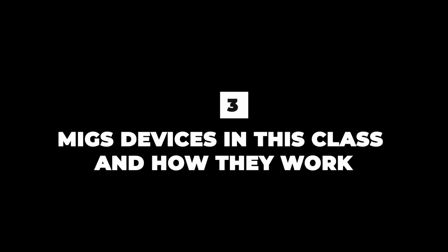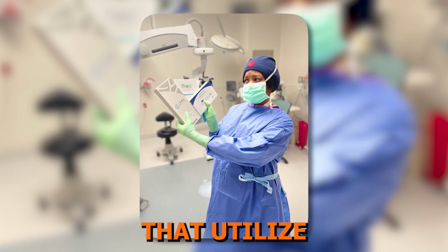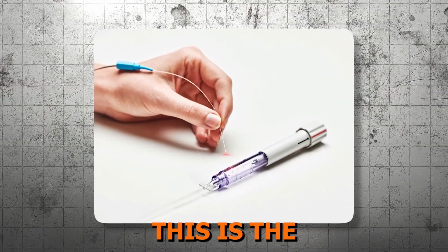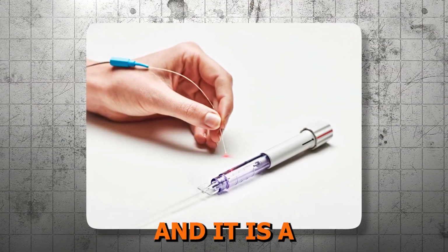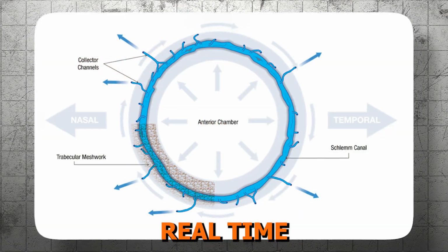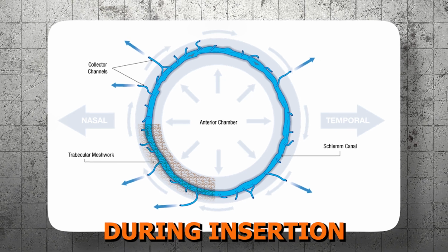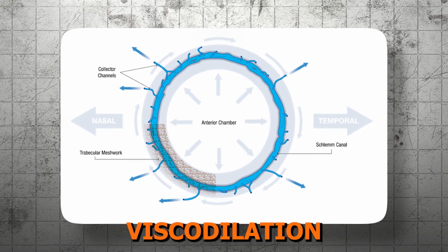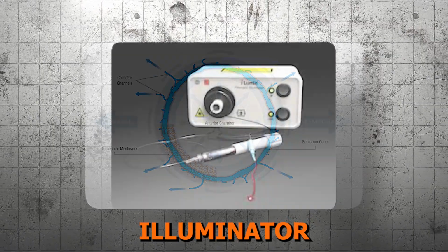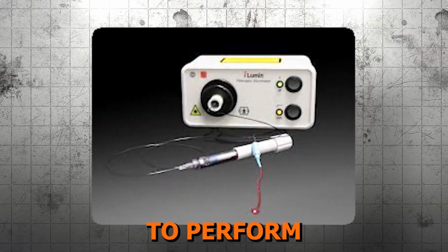Lesson 3. MIGS devices in this class and how they work. Now let's go over the devices that utilize canaloplasty. First up, we have the iTrack microcatheter. This is the first generation of the iTrack, and it is a flexible catheter with an illuminated fiber optic tip that allows real-time visualization during insertion and provides circumferential viscodilation of Schlemm's canal up to 360 degrees. Illuminator equipment is a requirement to perform iTrack.